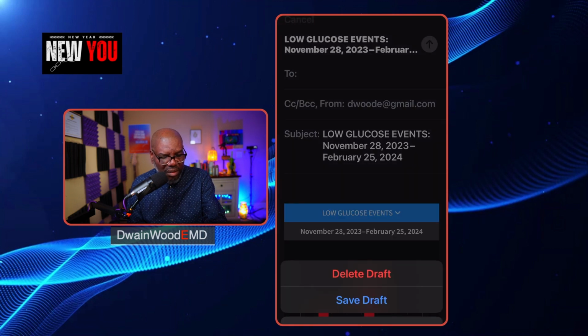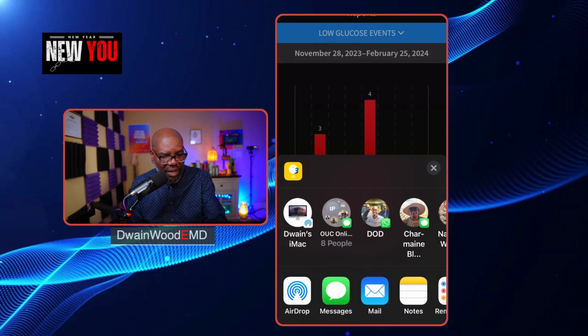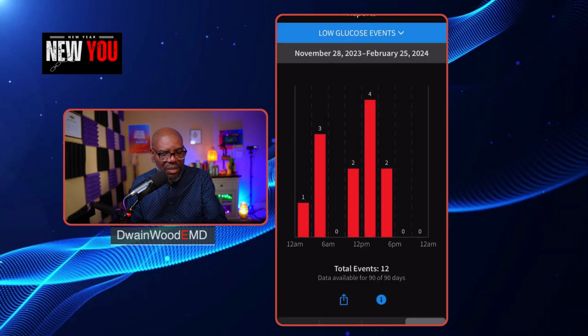Or I can, let's see, I can delete that draft, right? I can airdrop it. I can send to whoever I would like. So we're not going to do that now.